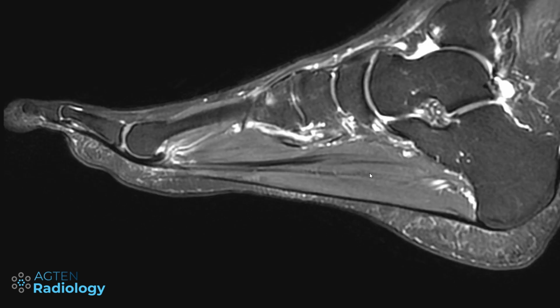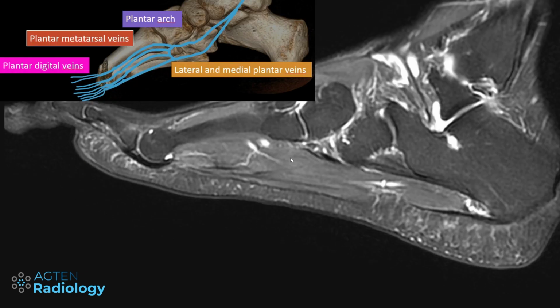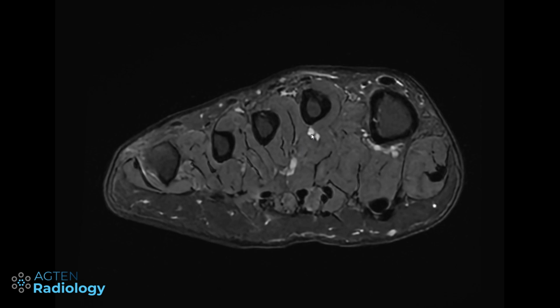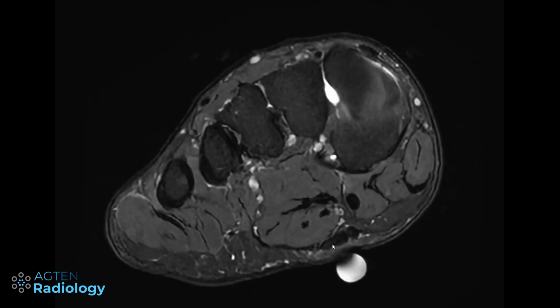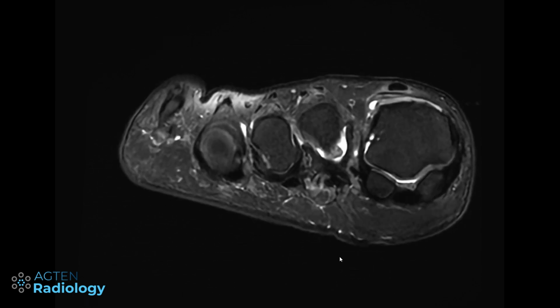Okay, so from here we go to the plantar arch. Here, there is also no thrombosis. Then we have the metatarsal veins going over. Let's switch on this side, so they are okay. And now we see, first of all, there's a marker somewhere. So this was the first marker, and I think there's a second marker somewhere here. We don't see it now.